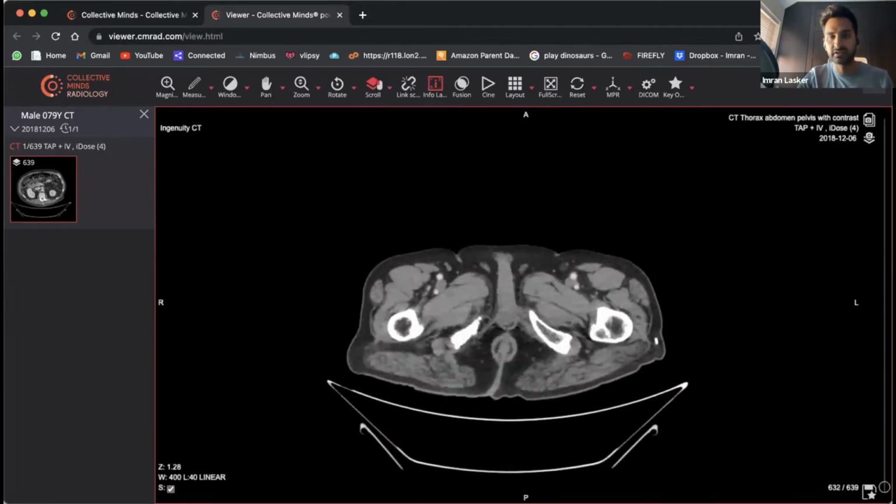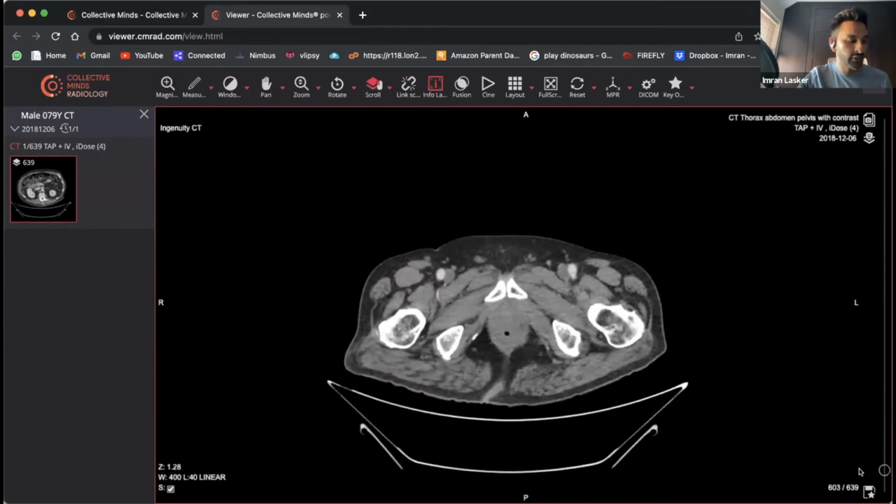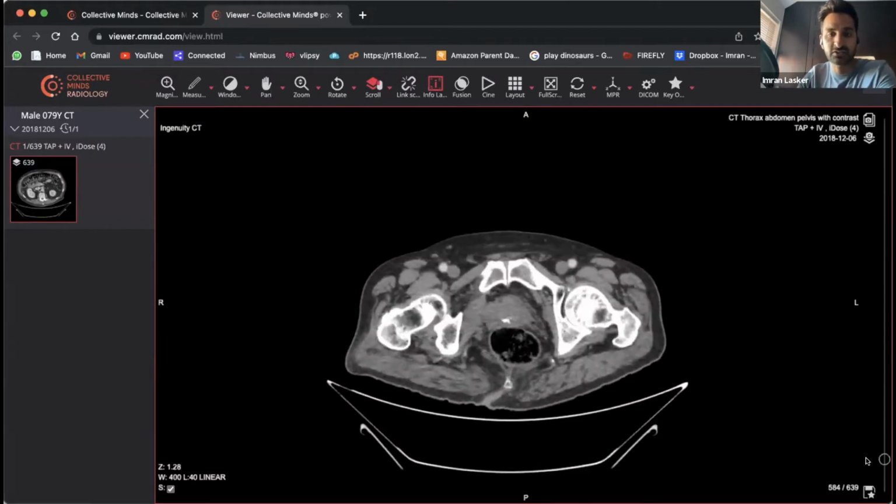We can't stop there. We also have to look at the bowel, because people don't turn up like textbooks, and part of being a radiologist is that you're still looking for other things once you've spotted the first thing. What they often say is it's the second fracture that gets missed. Most of the time, it's not the first fracture that gets missed, it's the second fracture. What I'm talking about is satisfaction of search. So we do have to keep looking.